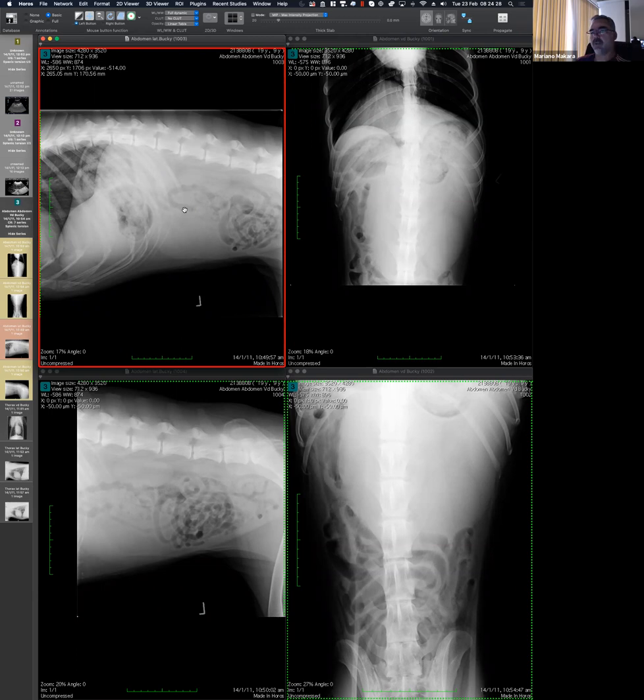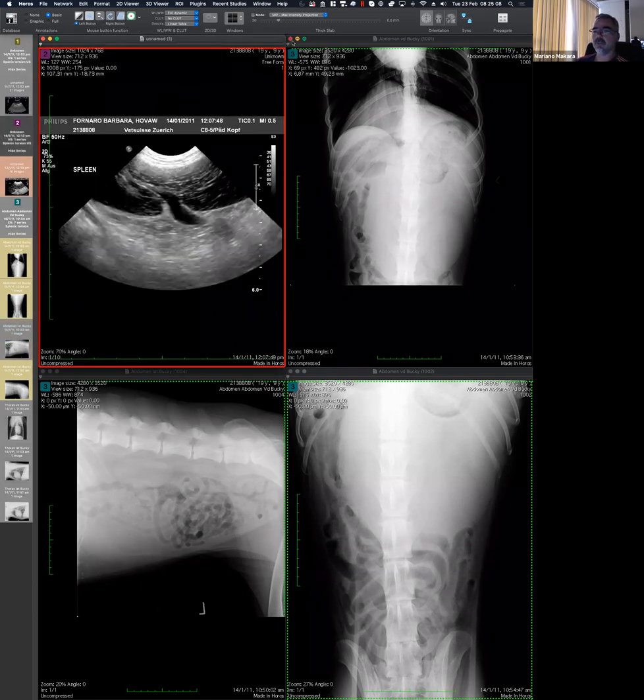But on the other side, you are saying, well, but it could be a torsion. And then the solution that you are offering is, well, let's do ultrasound. Hypothetically, ultrasound or CT or whatever you want is not going to be able to differentiate a hematoma from a hemangiosarcoma, but there is the expectation that a torsion should look different compared to the rest. So the obvious next step to make that call should be ultrasound. And we are lucky because I have the ultrasound, and this is how it looks. Let me double click.